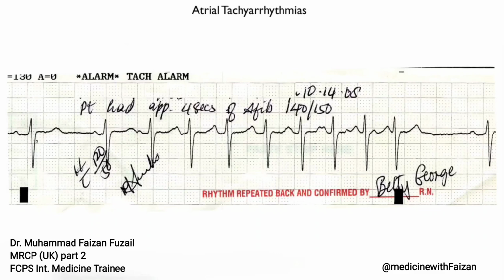We're going to start with our first strip here, and in this rhythm strip, if you glance across, you'll see that there seems to be a sinus beat that stands by itself in the beginning, and then suddenly it appears that the heart rate increases significantly. This sinus beat does have a P wave in front of it, and the PR interval looks to be at the upper limits of normal, probably 180 to 200 milliseconds. And the next sinus beat seems to be over here with a heart rate a little bit faster than 60 beats per minute, probably 65 or so.